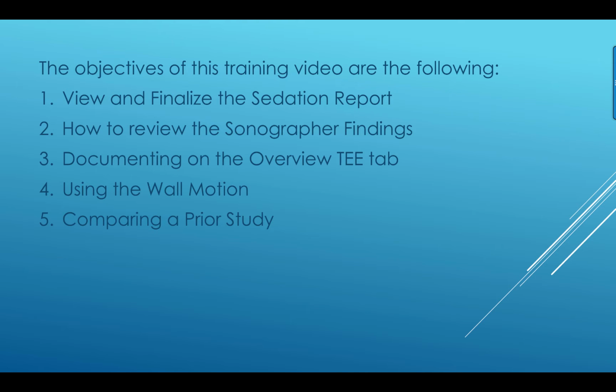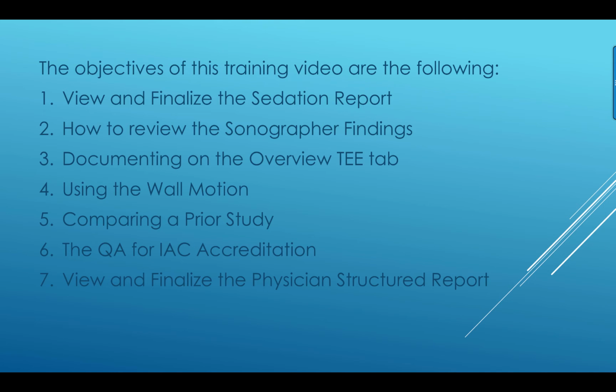5. Comparing a prior study. 6. The QA for IAC accreditation. And 7. View and finalize the physician structured report.